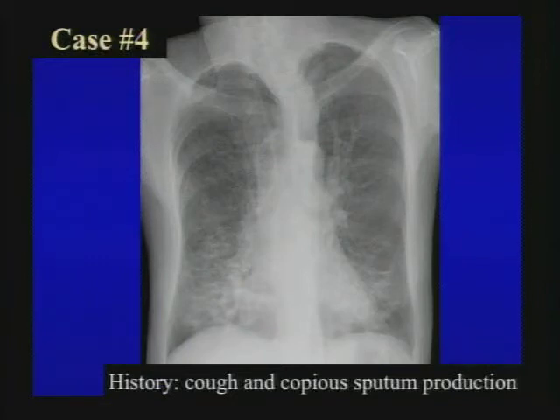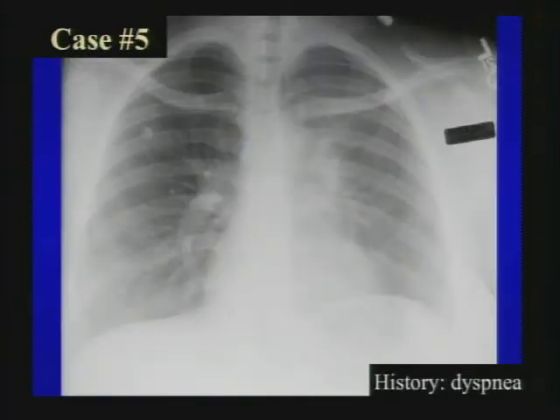What compartment of lung is affected? Alveolar, interstitial, airways, distribution, differential. Now, when I show board review to my fourth year residents, they always see this case, usually at the very end of the year, and they've seen it so many times, they all yell it out in one fell swoop.